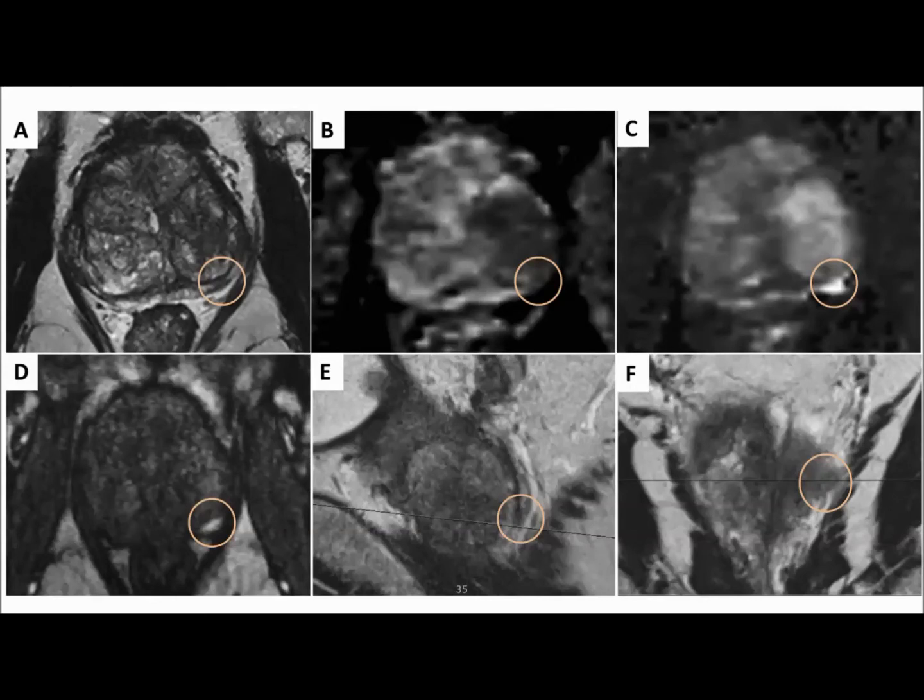So this was a questionable lesion, to be categorized in category 3. But further, we take the help of the dynamic contrast enhanced sequence, which is image D. We see a focal intense bright enhancing area which corresponds with the abnormality that we were able to see on images A, B, and C. So based on this enhancement, we will award one more score for this lesion, from category 3 to PI-RADS category 4, making it highly suspicious for a possibility of cancer.